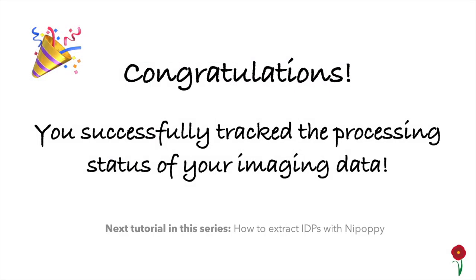Congratulations! You are now ready to extract IDPs from your imaging data.